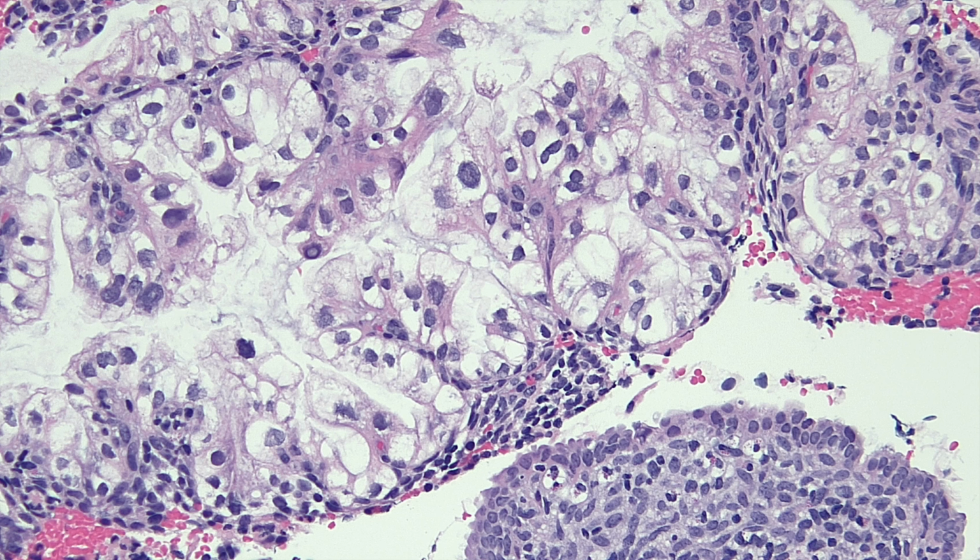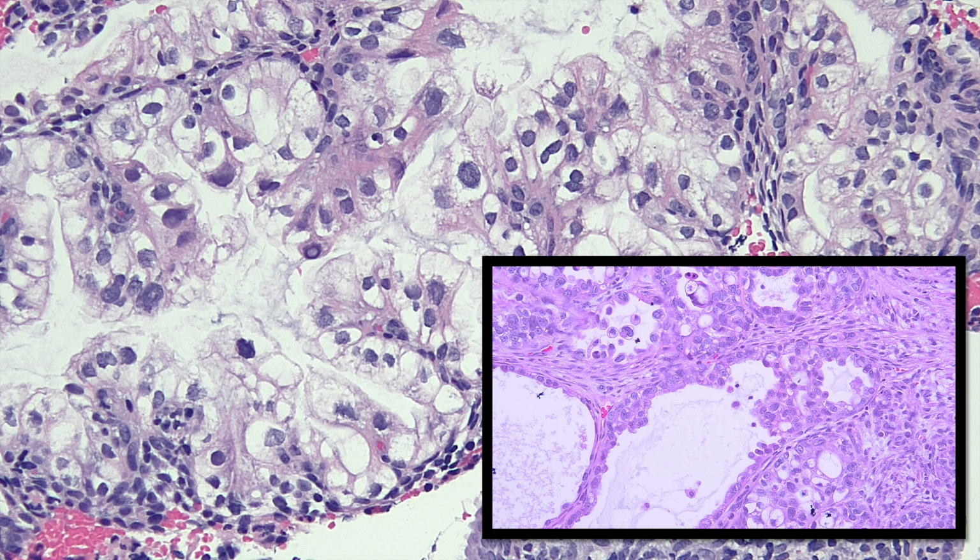In situ forms of adenocarcinoma of the endocervix can be within the differential diagnosis. However, Arias-Stella reactions should show little to no mitotic activity and very rare apoptotic debris. It's important to distinguish from clear cell carcinoma, which can occur not only in the uterine corpus, but also in the endocervix, which we'll discuss later in the presentation.